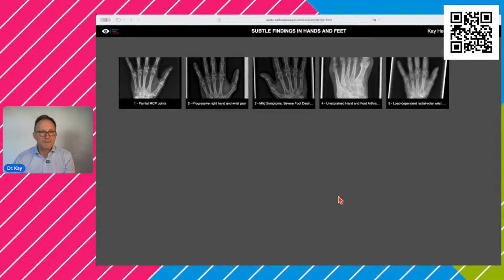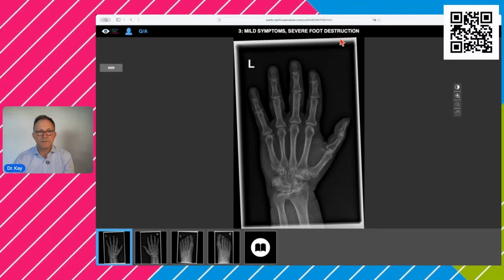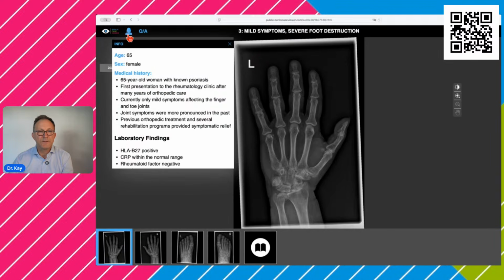Okay, next is case number 3. Case number 3, mild symptoms, but severe foot destruction. Let's check it. So there's no follow-up here. It's a woman, 65 years of age.